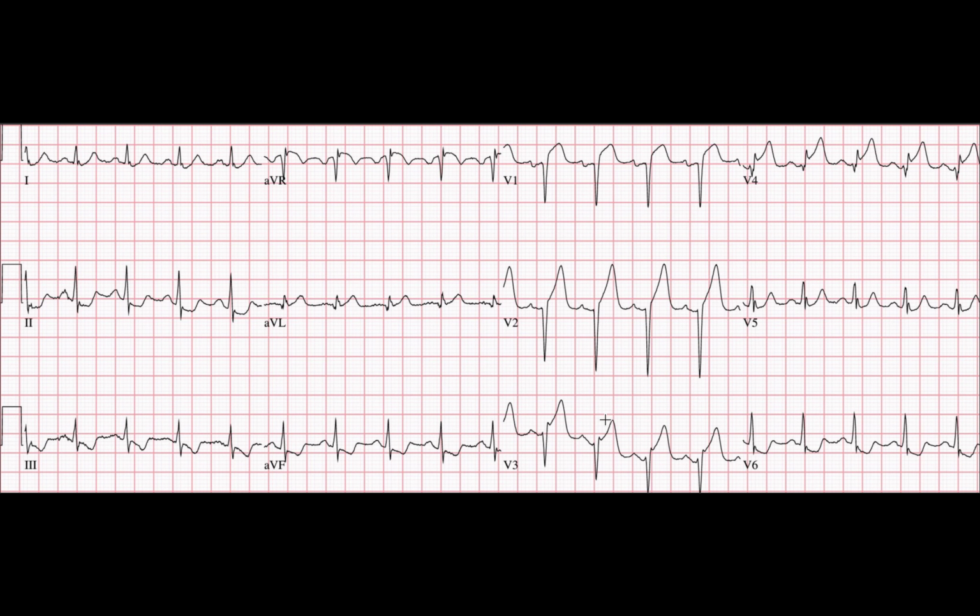Now we move on over to our chest leads, V1, V2, V3, V4, and you'll notice, boom, right here, we have a huge bump up. What we call this is a tombstone, and it means the person's going to die if nothing happens. There are some times where this can happen in people and it's not really that bad. It's called a left bundle branch block criteria that we exclude it, if they have this. But that's another story for another day. We have this huge bump, and you'll see even another one that I think we call De Winter's T wave morphology. It kind of looks like sailboats or shark fins, is what some people say.